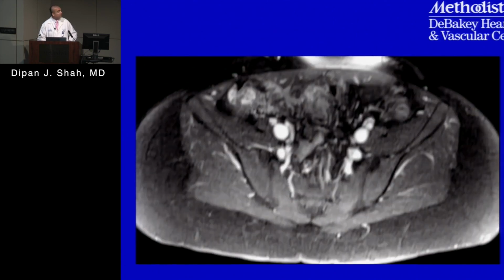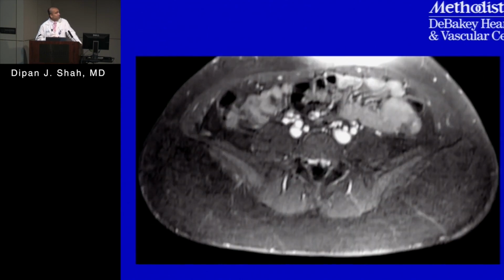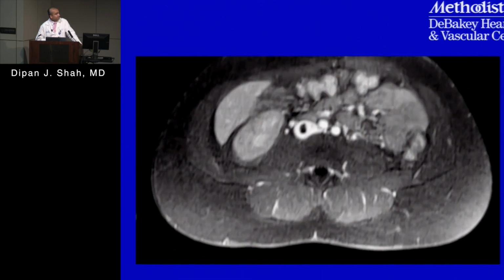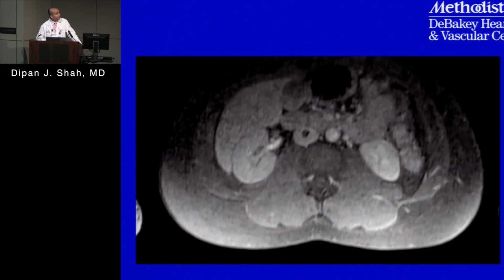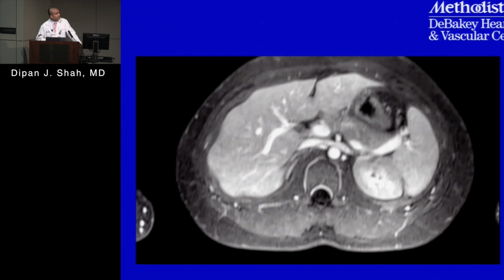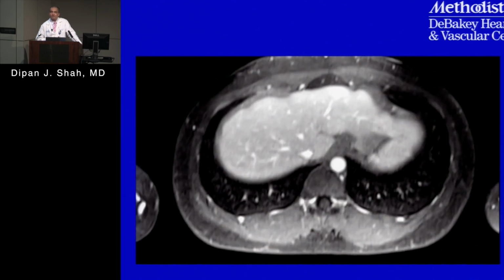So take a look through these. Again, we're starting just below the iliac bifurcation, and then we're coming up towards the diaphragm. And what do you see here?